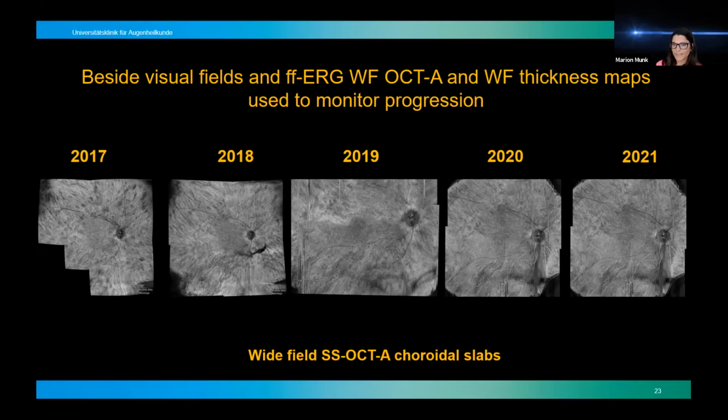Another benefit is that you can really quantify choroidal lesions here, and you can really compare the lesion size with previous visits, Mariam, with the current visits.